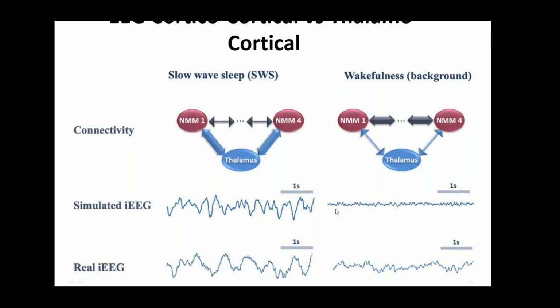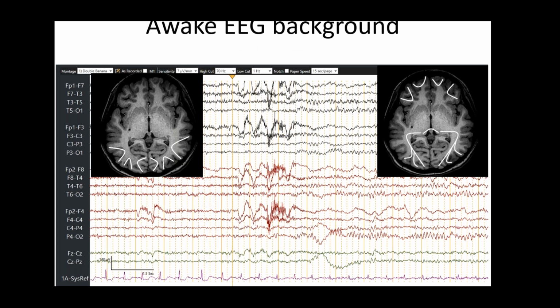All right. So this is an example of an EEG. On the left side, you see a wake state with the eyes open. So the eyes open means that the background is going to be low voltage beta activity. The posterior cortex is going to be engaged because you have eye stimulation, all the calcarine cortex, and this is activating this cortex that has these very small local networks. The product of these local networks' oscillatory activity is in the beta range.